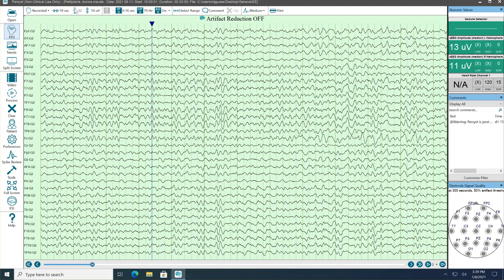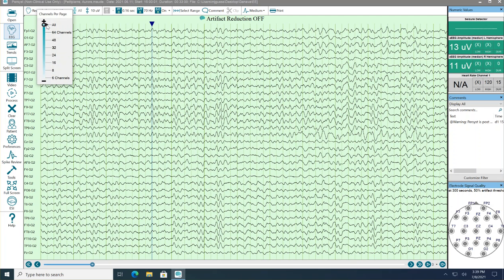So now I'll go ahead and select it back to all. So I'm showing all the channels. These are all the inputs that have those 1010 labels. So without having to hunt and peck and select and all that, I can use the menu to select a subset, invert that selection, delete them, and I've got this. So what do I do with this now?